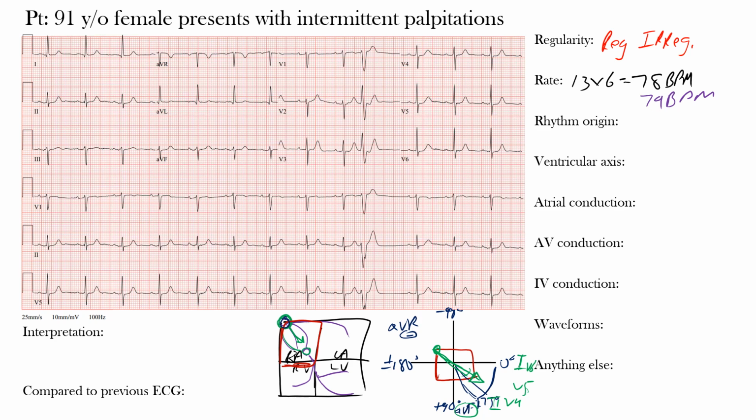So this is all for sinus rhythm, again, originating from that sinus node. So lead 1 is here, so you can slightly see some P waves there, and lead 2 is here. These are all upright P waves, all similar morphology. Here's V4, V5, and V6, where you see these upright P waves. And we can also see them in AVF, right there. And then in AVR, we said we would see those inverted P waves. So here's AVR, and that's why you see these negative inverted P waves.